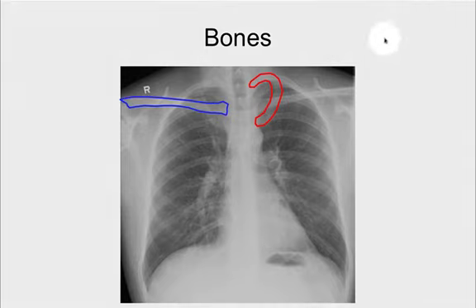If we count down, 1, 2, 3, 4, 5, 6. There are approximately 6 in the mid-clavicular line that can be seen. So there is actually adequate inspiration on this chest radiograph. When you count down the ribs, also look for any obvious rib fractures.